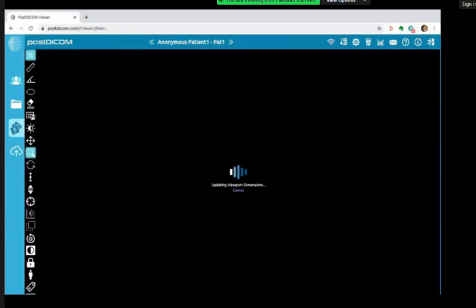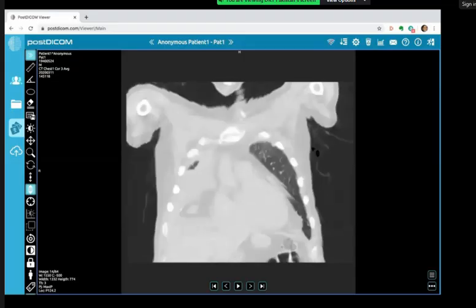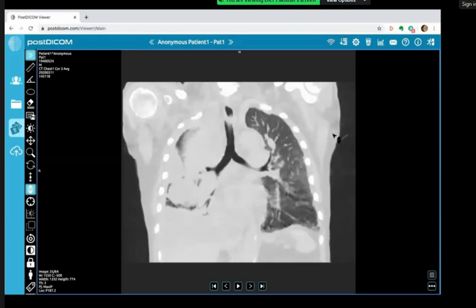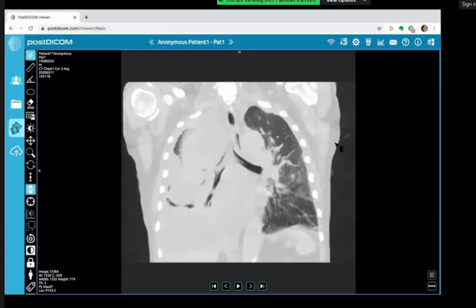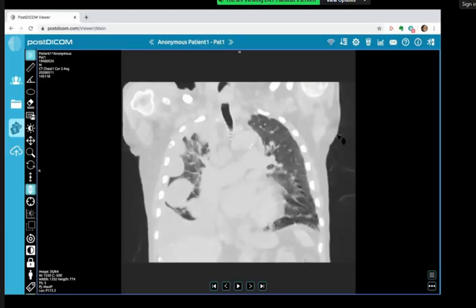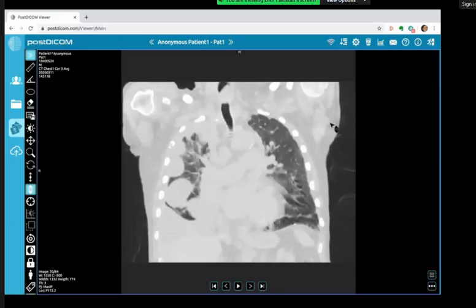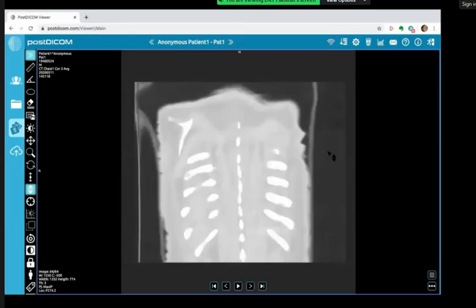As suspected on the X-ray, I would be suspicious of diffuse pleural involvement, and I would ask about any history of asbestos or industrial exposure, but the pleural thickening is suspicious for a malignant process. I can probably just see tiny calcifications at the base on the right pleura. I would be thinking along the lines of a mesothelioma, and the second differential would be pleural-based metastases, but that is unlikely given the one-sided involvement and loss of volume.